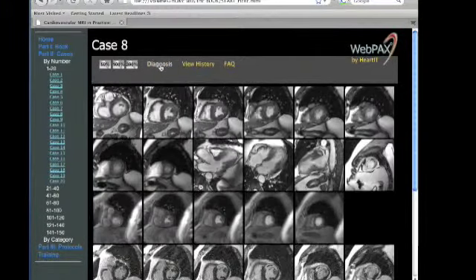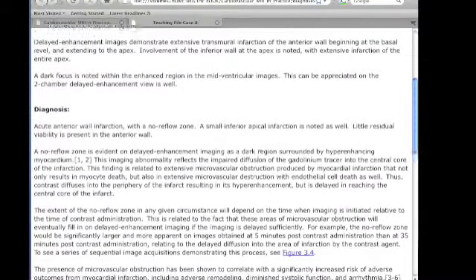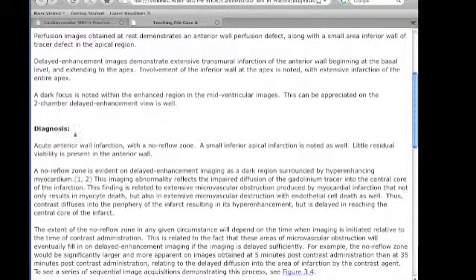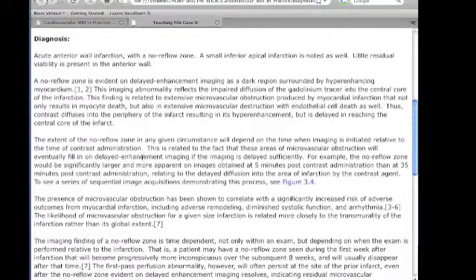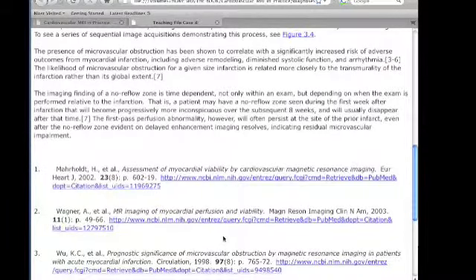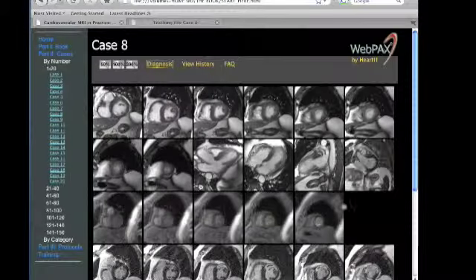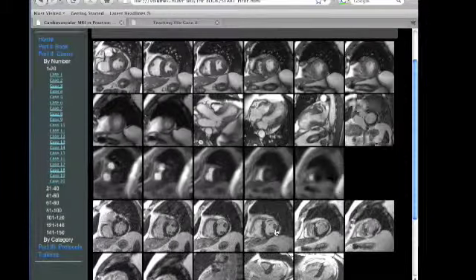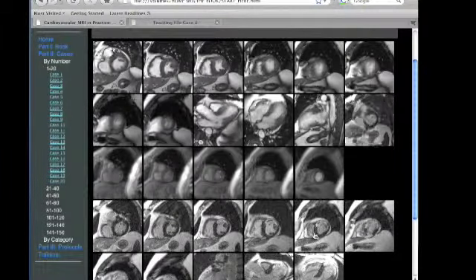This finding indicates that not only have the myocytes undergone necrosis, but indeed the small microvessels leading into the area of infarction have also undergone necrosis. This diagnosis is confirmed on review of the diagnosis within the discussion, and references are given regarding the no reflow zone and the use of myocardial delayed enhancement for myocardial viability analysis. The myocardial no reflow zone demonstrated on delayed enhancement imaging is noted to be associated with increased risk of adverse remodeling as well as other major adverse cardiac events.